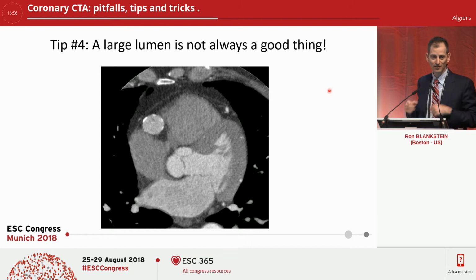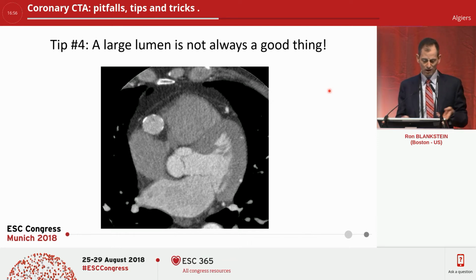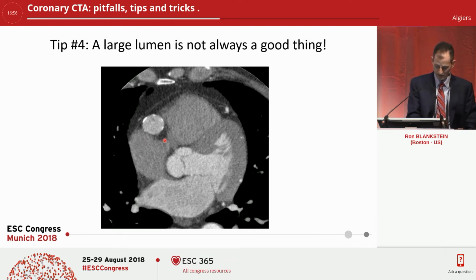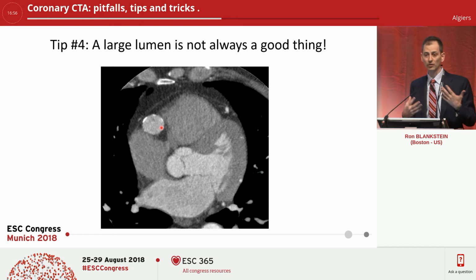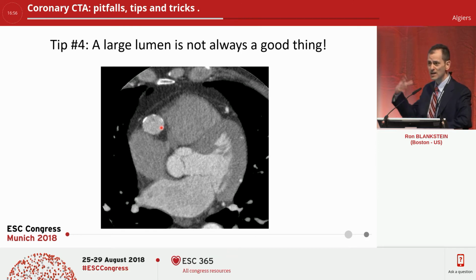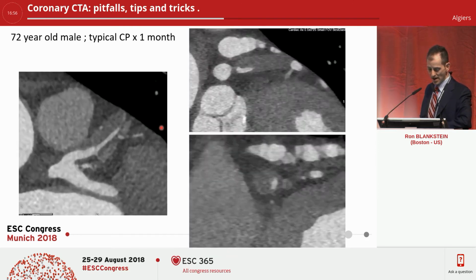We always know that a stenosis is bad, but what if your lumen is just large? Like this patient with Kawasaki disease that develops calcifications on the periphery. They don't have any clots, but having a larger lumen, which can occur from Kawasaki, from vasculitis, from IgG4-mediated vasculitis and many other entities, can be a bad thing.